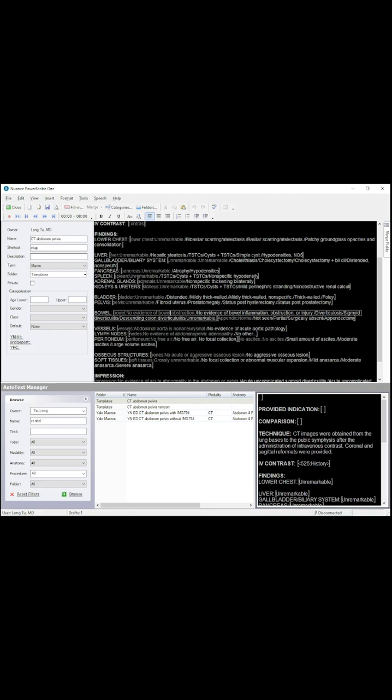You can see here the fill-in fields. We find the bowel one, and we're just going to add something after here. One of the things I've been wanting to do is add a pick list where the default says no evidence of bowel obstruction, and there are pick list items to add diverticulosis and other things, but then you've lost the no evidence of bowel obstruction. Sometimes I want to add just an additional pertinent negative or an incidental finding, but I don't want to remove the no evidence of bowel obstruction, right? So I want to add a new field to be able to do that.